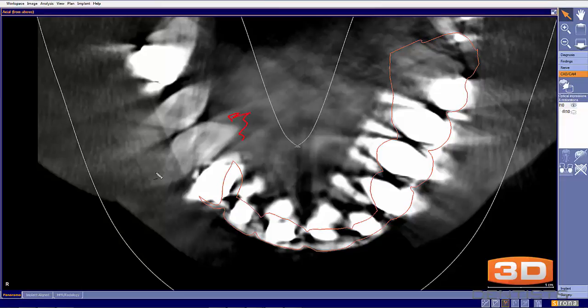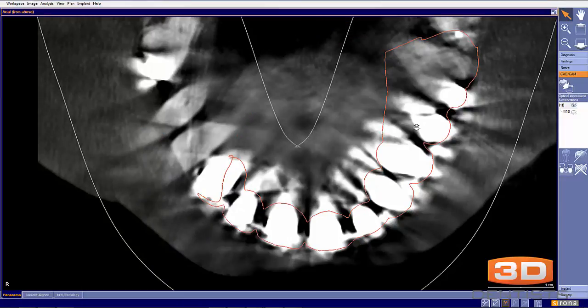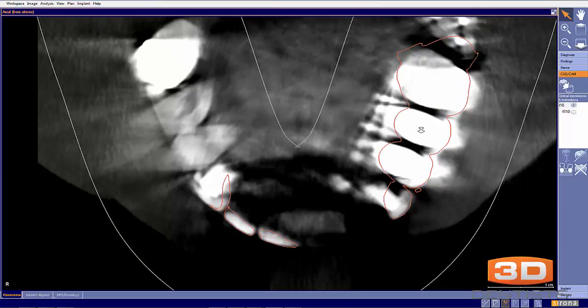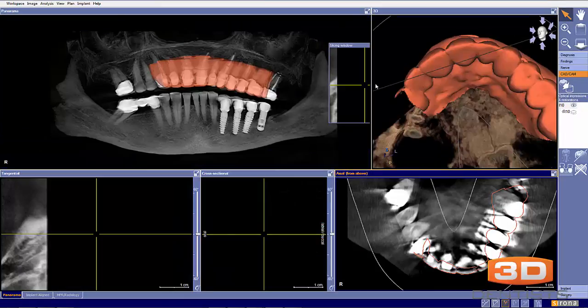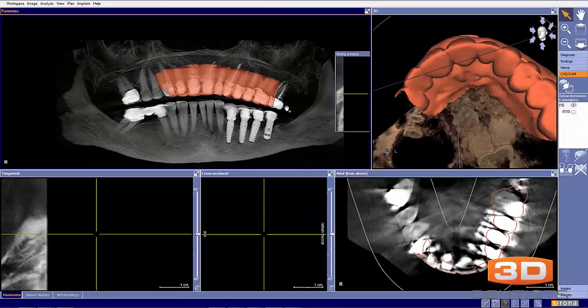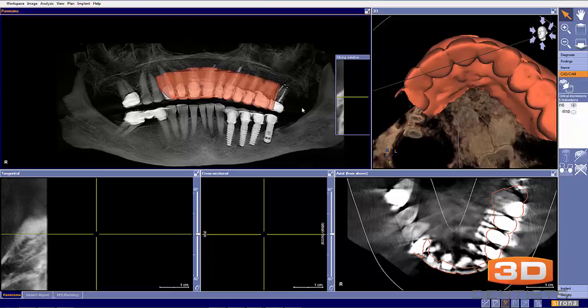You can see scatter there and there where it becomes harder to see the outline of the teeth. So having looked at all of that, while we do look like we have a good, accurate integration of our cone beam data here, there's no way to know with 100% certainty how accurate it is. That would lead me to want to use an analog workflow here.